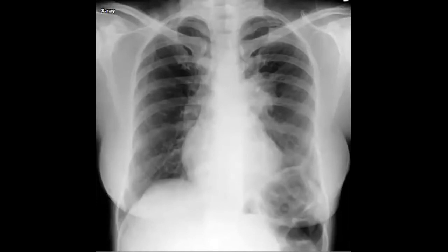This is a plain chest X-ray, as you see. It's not an easy one, but when you go to check the regions of importance, like the costophrenic angles on both sides, you can see the left hemidiaphragm is elevated upward, right? And the most important, Dr. Nakhil, yes, that you can check the left hilum. So the left hilum is bulky. So there is a left hilar lesion or obliteration.